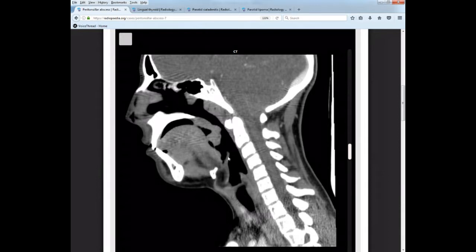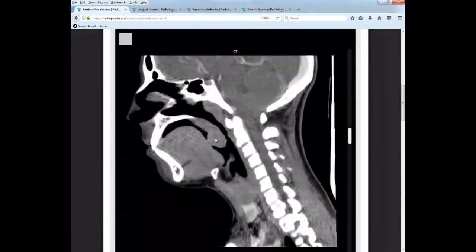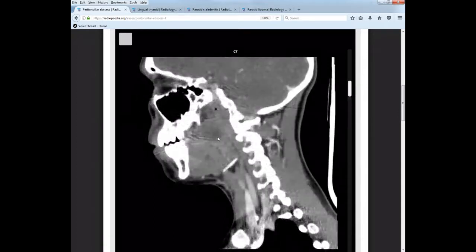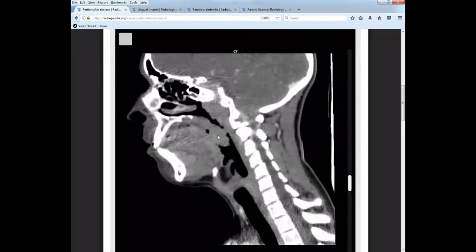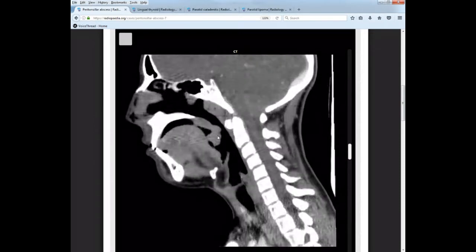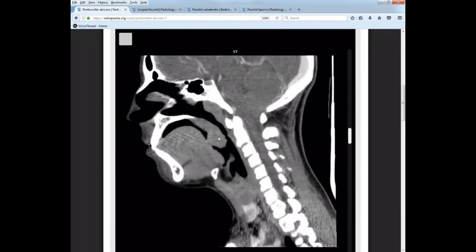And the oropharynx includes the lingual tonsils, which are at the very back and base of the tongue, which you can't quite see here. But you can see the palatine tonsils, the tonsils that you can see at the back of your throat. They're hanging right here, okay, on both sides. There's one and there's the other, okay? So there's your tonsils, your palatine tonsils.